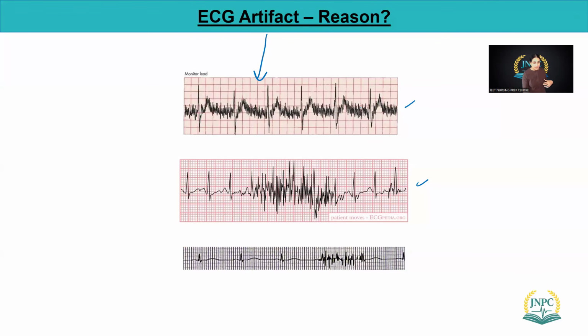Do not think it's just drawing. But look at that. Do not overthink that, okay? Before it was okay, but right now it is going like chaos. We haven't done anything like that, right? When you see this kind of pattern, we have added lots of strips here so that you can have a nice idea. Okay, all right. So that's our ECG artifact. You know the reason. Fix the cause, you'll see the nice rhythm.